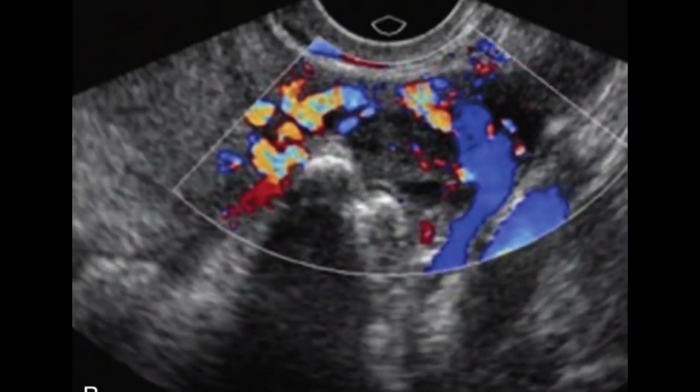This is an image of the same patient which you have seen previously. This is again the same mildly dilated fallopian tube, but one important point is worth noting here: the surrounding vascularity, the hypervascularity in the surrounding area, is visible, which shows that some inflammatory changes are going on around the fallopian tube, around the ovary, in the parametrial region. So this vascularity is very important to pick up pelvic inflammatory disease.